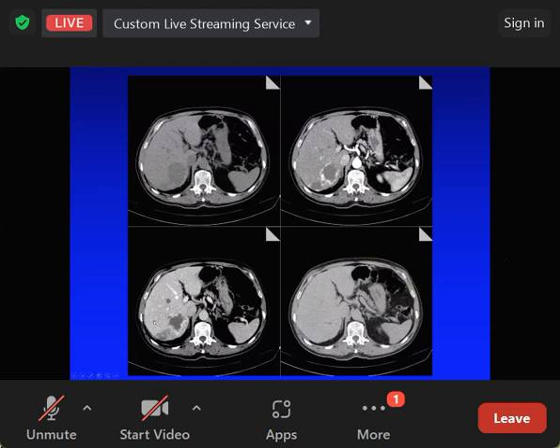Here on the bottom left, we've got portal venous phase. Notice we've got enhancement of the portal veins here, and you can see how the enhancement is gradually filling in. And then on, I think this is probably a 15-minute scan, and the whole lesion is filled in apart from a little central scar. When you compare this to the unenhanced scan, and this is a typical hemangioma, you don't need to go any further, you've proved it.